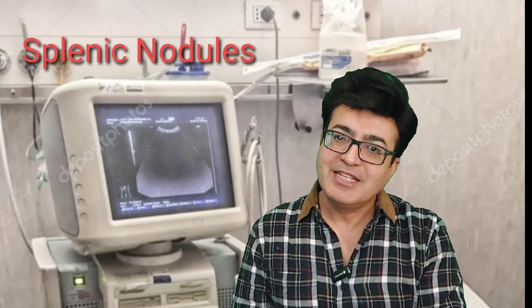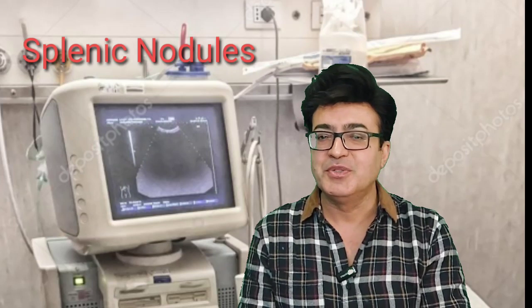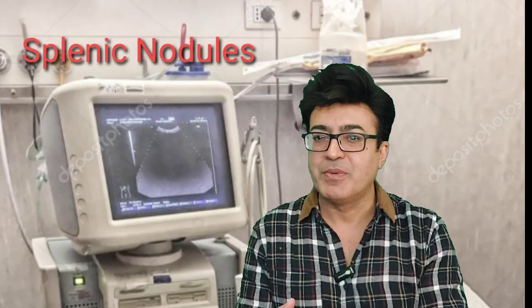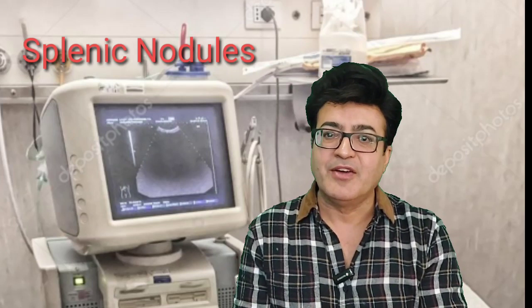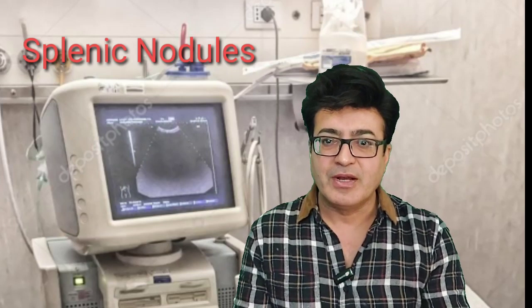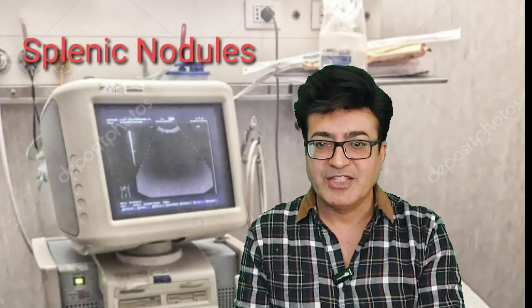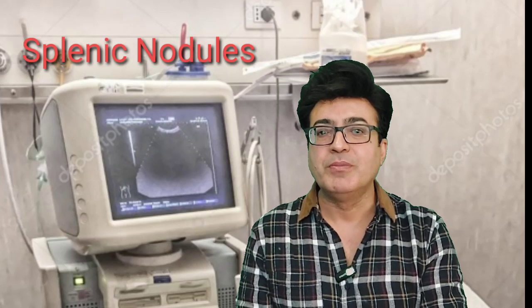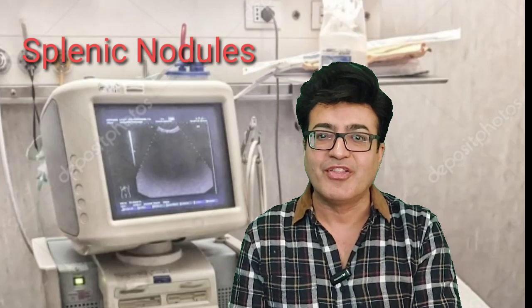As far as splenic lesions are concerned, these are very easy, nothing to worry about. As I mentioned, you can have them at your fingertips. You should have the information of the patient with you. If you have it, well and fair enough, and if not, you could just think of these five differentials. It could be tuberculosis, or it could be infection or abscesses, it could be lymphoma, or it could be metastatic disease, and certain other diseases which I will discuss in these videos.